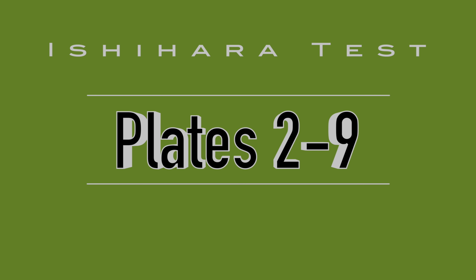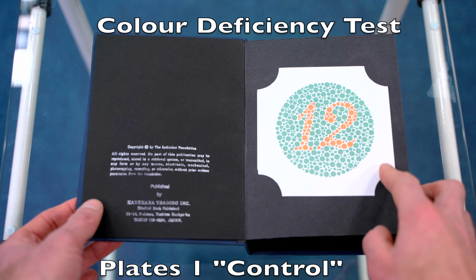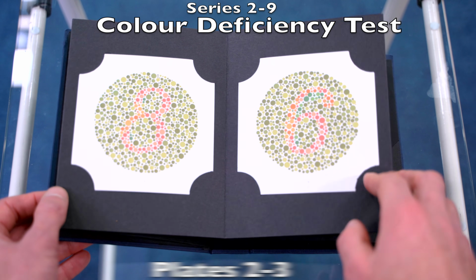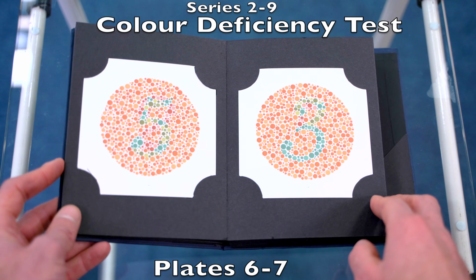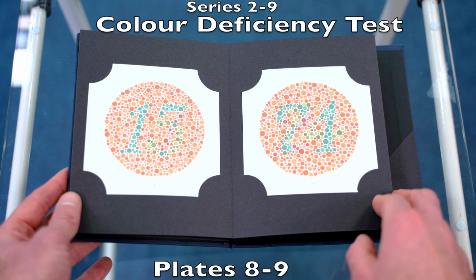So let's have a look over those plates now. Please write down the numbers as you perceive them as we go along, and then we'll top them all up at the end. So for column 1, everybody should be seeing number 12 on plate 1. Plates 2 and 3. Plates 4 and 5. Plates 6 and 7. Plates 8 and 9. So that should complete the plates for column 1.